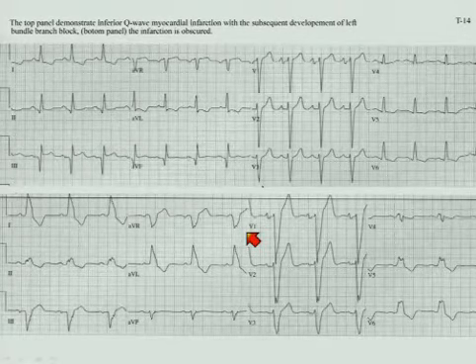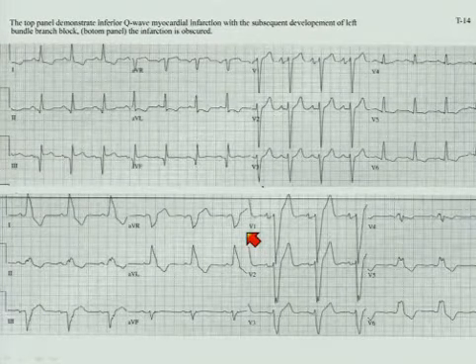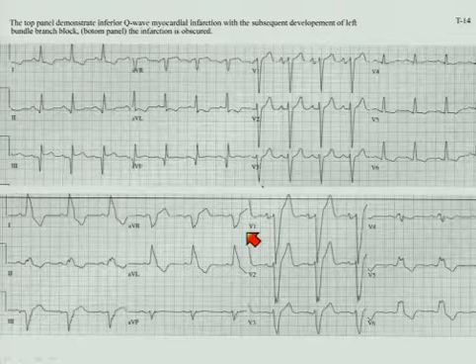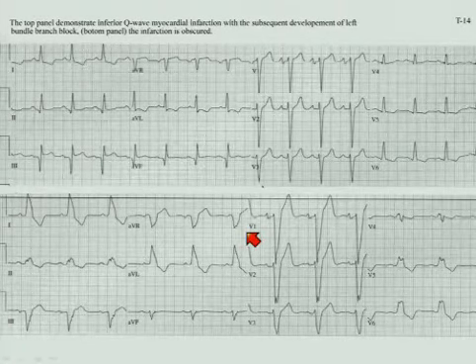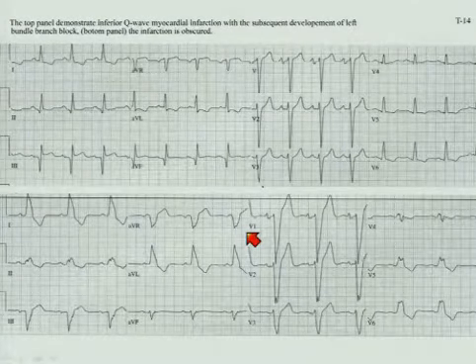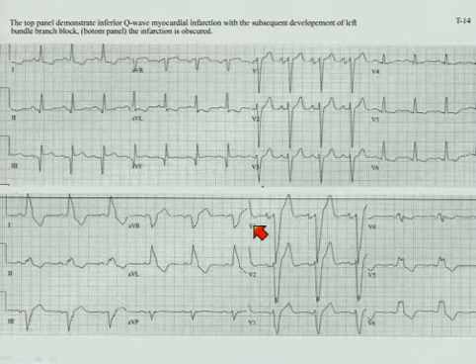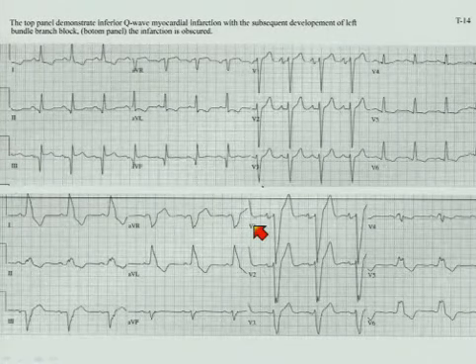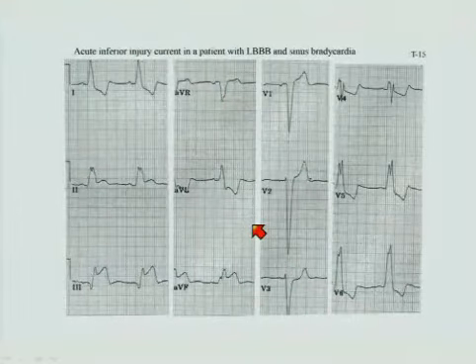So we generally say in electrocardiography that when it comes to myocardial infarction, the left bundle branch block precludes you from saying anything definitive, and you have to rely on means other than the electrocardiogram. That's not absolutely true, right? You know that. It's generally true. There are a few patterns that can still be very suspicious for myocardial infarction, even in the setting of left bundle branch block. Let's look at a couple of them.